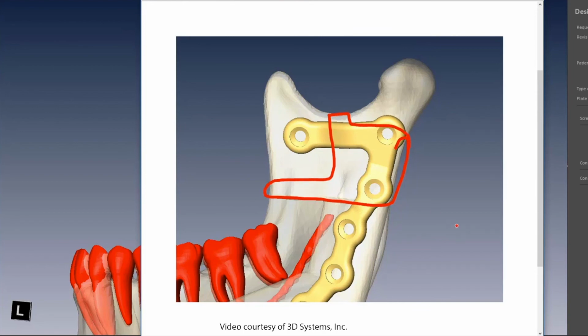Yeah, so I would prefer to have the sigmoid notch hook in, please, and that gives me a 3-point localization of that posterior cut. It'll slot in quite nicely into the sigmoid notch. All of that will be exposed for plating anyway, so it's not particularly cumbersome to get into the sigmoid notch. Perfect. And then in the blue there, we would include the predictive holes, and then in 1 to 2 different positions across that guide, we would also include a set of fixation holes just to hold that guide in place while it's being used. Perfect. That nicely demonstrates predictive holes.